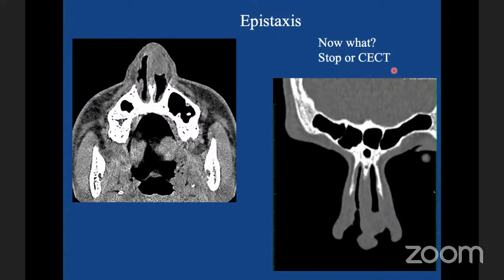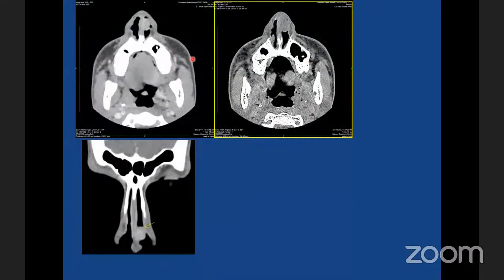Our example here is tumors and mimics. We are going to do contrast-enhanced CT scans. So what do you find here? You have a heterogeneously enhancing oval lesion, which was what I showed you on the plain scan. It is a heterogeneously and partially avidly enhancing lesion.